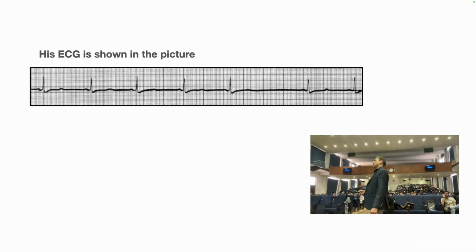The P wave is there. It's coming from the sinus node. Why AV nodal block? Where is the conduction? Where does the PR interval belong? What you want to tell is the Wenckebach phenomenon you are talking about. This is not Wenckebach, we'll see in our lecture later on.